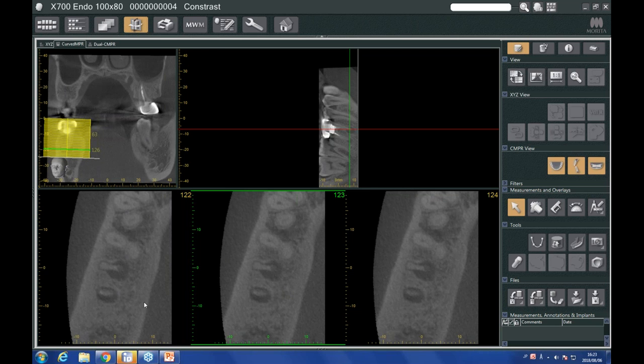So again, if I was focused on just dental arch view, then I wouldn't consider necessarily looking at it in this way. So what I want to encourage all of you to do when you're working with cone beam imagery and software that gives you this kind of freedom is to really make use of that, to make sure that you can see a tooth from every conceivable angle, because that is the power of 3D imaging.